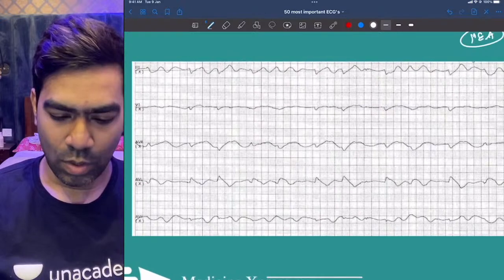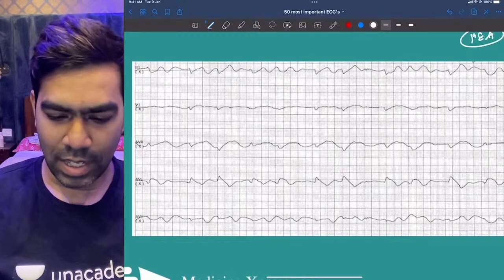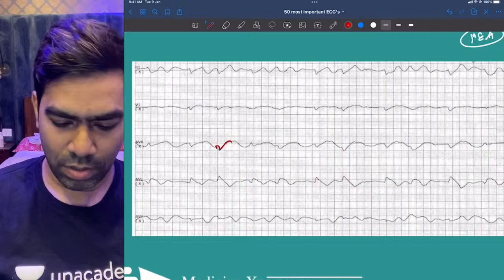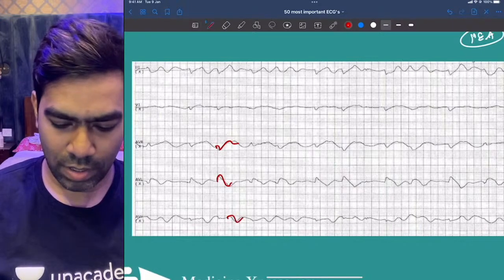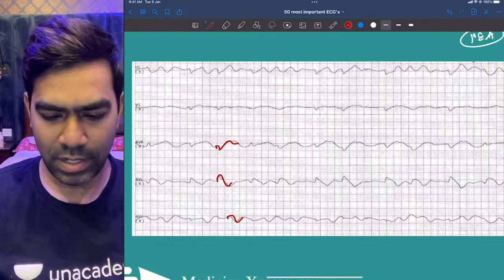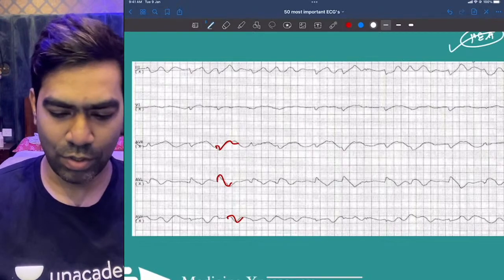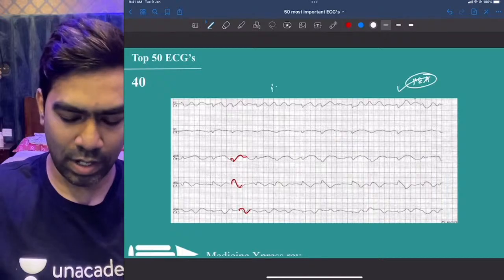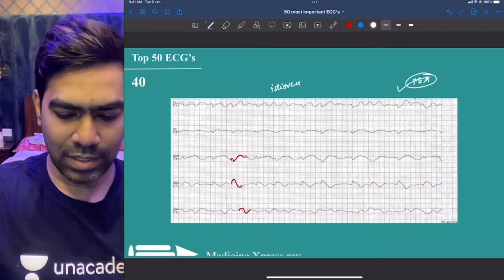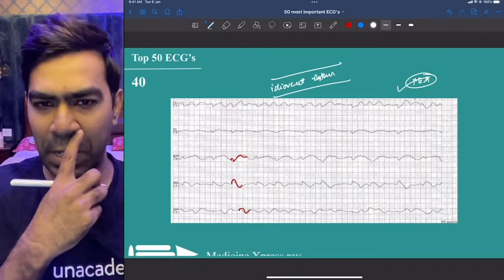And look at this one. If you look at this EKG, there is some rhythm going on. It's a ventricular rhythm only. But this patient is unlikely to have a pulse. In that case, you're going to call it pulseless electrical activity. So these are called idioventricular rhythms. This is not an accelerated idioventricular rhythm. This is a very slow rhythm going on. This is an idioventricular rhythm basically.